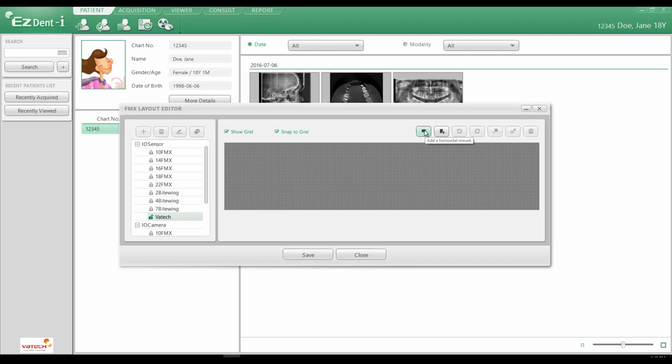We'll click once on the horizontal frame, left click, put that into place, left click again, add another one, left click again, put in our third, and now we'll put 3 more for the left hand side of the arch. Left click and drag it over, left click, and then we'll go ahead and rotate it around 180 degrees. Left click and add another one for the left hand side, rotate that 180 degrees, and add one more to put on the left hand side, and then rotate that 180 degrees as well.